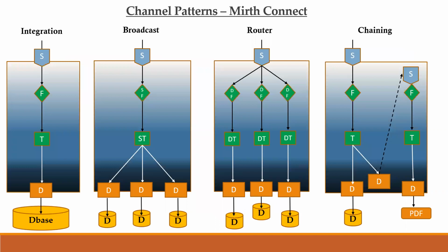So here we are going to take a look at various types of channel patterns that we can create in Mirth Connect. Okay, now this is to give you a general idea to understand how the various patterns can be created within Mirth Connect so that you can get a better idea of designing a channel based on the requirement that you have in real time. Right? So let us go ahead and take a look at that.